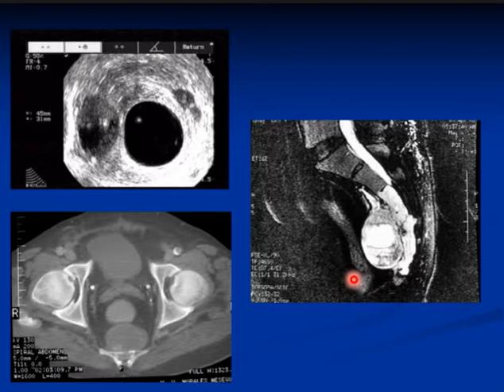So it's hyperintense on T2, and the distinguishing thing is the involvement of the adjacent sacral segments. That's S3, S4, and S5. So it is involving the adjacent bone, like here, here, and there.